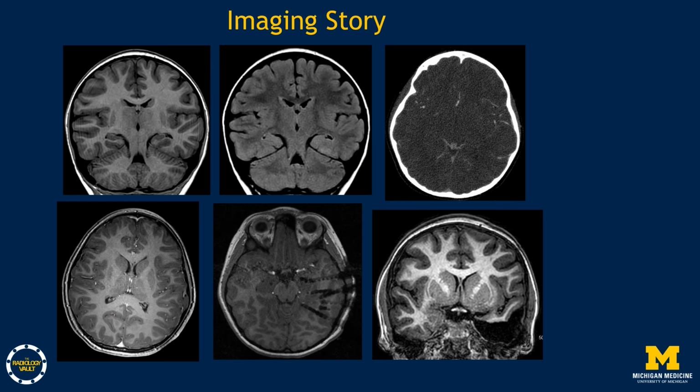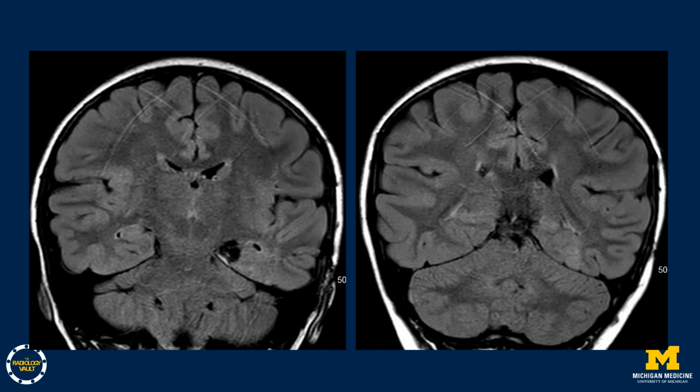As you can see here, residual abnormality remained present in that left inferior temporal lobe in these two images. This is the resection of the left hippocampus. The surgeon knew that this abnormality was left, but it's important for the radiologist to know this too, that we not only report postoperative findings, but also that there's residual abnormality. Additional surgical intervention was proposed.